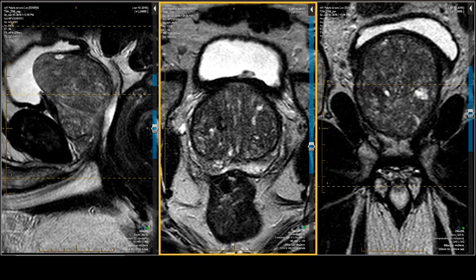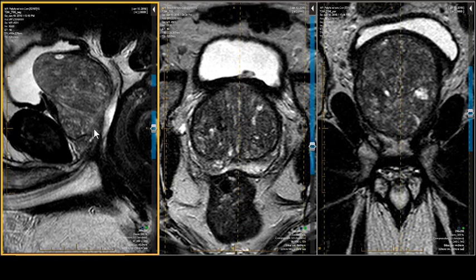The lobar classification of BPH comes into the subsegmental division of the different types of BPH. Now, usually there's stromal and epithelial hyperplasia, but there's also another factor. There's muscular dynamic contraction, which further inhibits the patient's ability to urinate. So let's look at BPH from the standpoint of anatomy, and I like to look at that in the sagittal projection, believe it or not, even though a lot of the PIRADS designations are made off the axial.